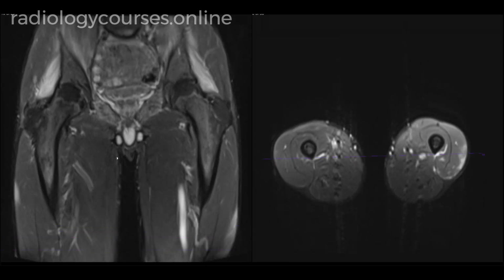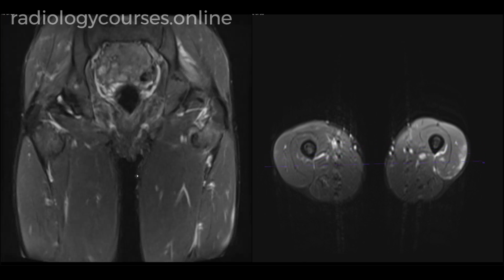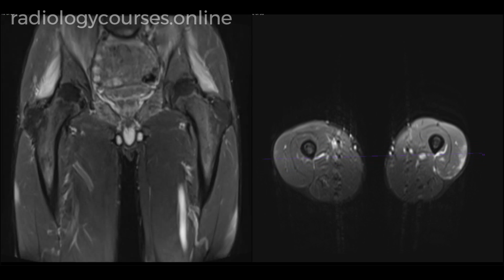On T1 sequence, there is no evidence of muscle atrophy or fatty atrophy of the muscles. So, in summary, here I'm showing a case of acute myositis in a proven case of dermatomyositis with anti-SAE1 antibody.